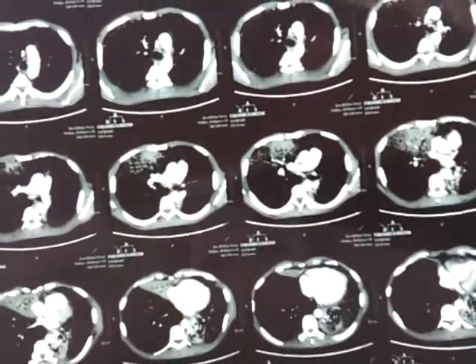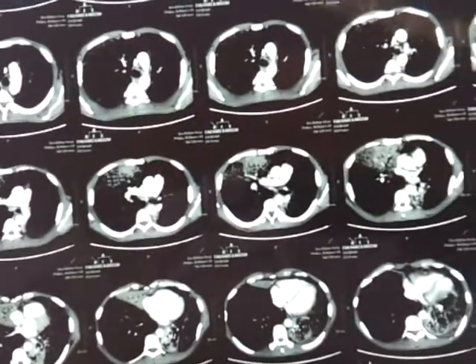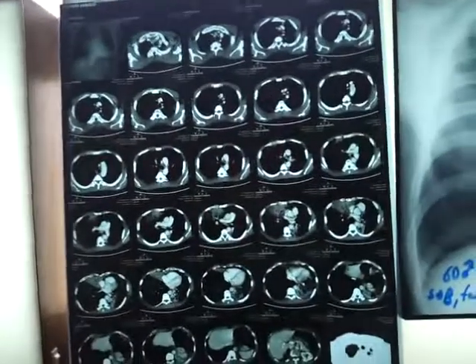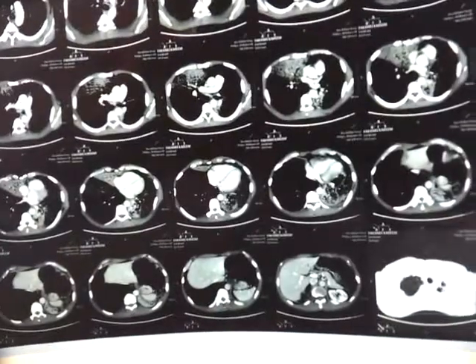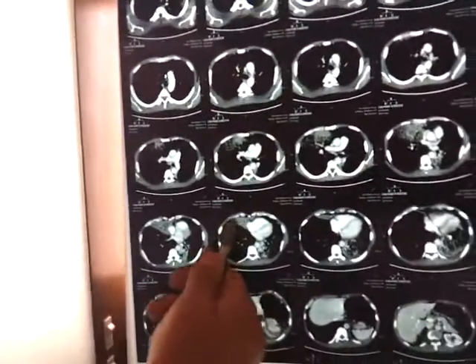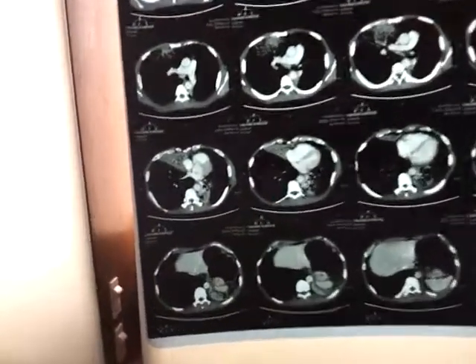Pneumonia is acute inflammation of the lung parenchyma. It is the most common killer among infections in human beings. Pneumonia, some say that it kills nearly 100,000 every day. That's pneumonia, especially in extremes of age, elderly and young patients. And this is actually a lobar pneumonia. Lobar pneumonia. What is the cause of lobar pneumonia?